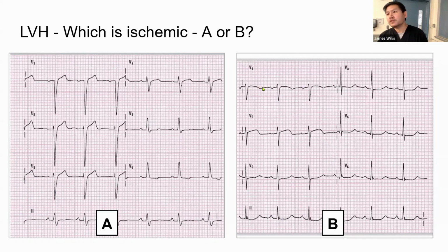It's kind of not curvilinear. Here it's about to get convex. And here you have depression, and they're pretty equal, but it looks almost concordant. So B is definitely ischemic, enough to make you trigger STEMI, it's up to you.